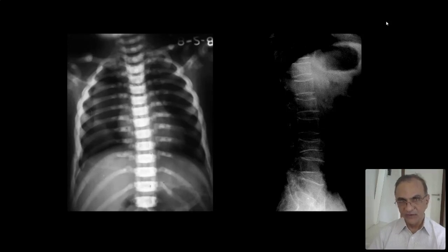I don't have to explain. This is more than normal. The left one. The right one, you can hardly see the image. If you're in a lighted room, you can hardly see. On the right, you have images where the bone itself is hardly seen, but you can see the end plates of the vertebra. So again, we go back to this.